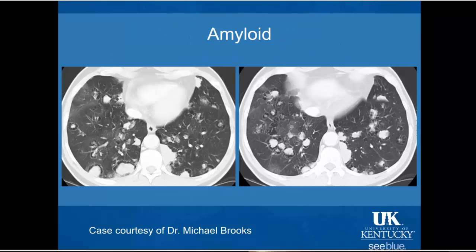So here's a case. We see a lot of nodules, but notice surrounding all of those nodules is this unusual looking cystic abnormality that is probably due to some pretty severe desmoplastic reaction and alveolar wall destruction surrounding these pulmonary nodules. I don't show it to you on these views, but several of these nodules demonstrated some abnormal areas of calcification. So this is not a pure cystic abnormality for a lot of this, although there are in the right lower lobe some actual bizarre looking cysts.